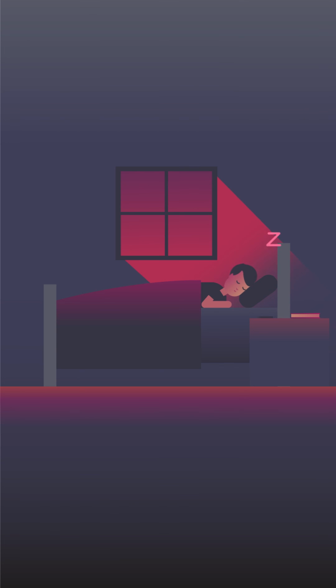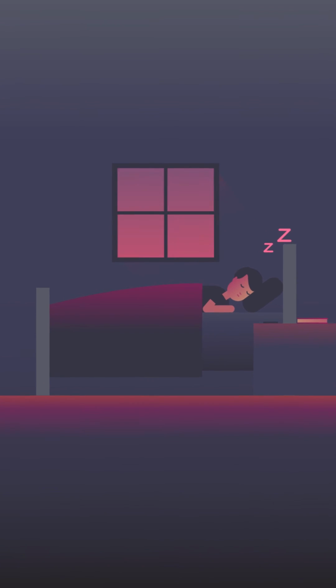Used frequently, DROWZLE can help you monitor your sleep breathing health to tell whether it is stable, getting better, or getting worse. More restful sleep means more alert days. Sleep well.